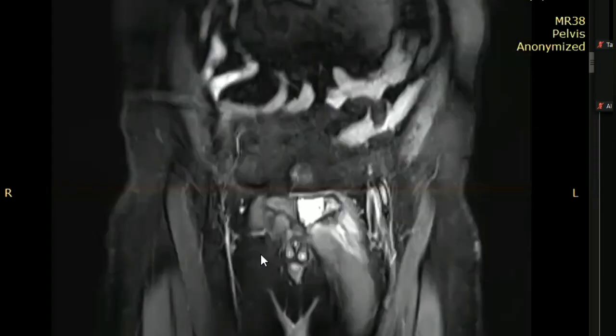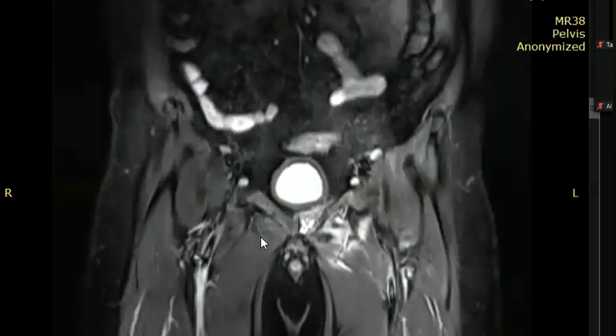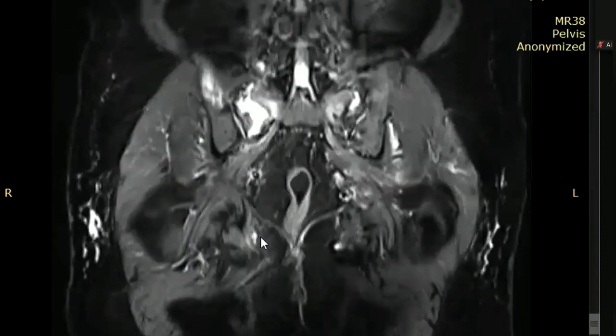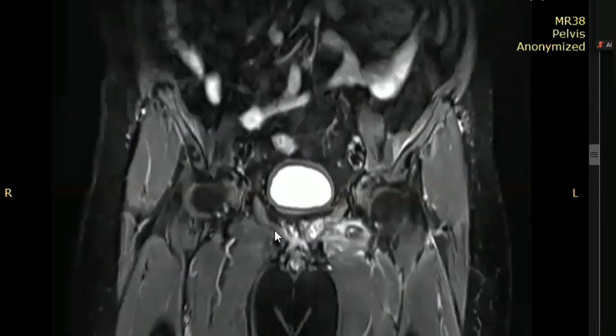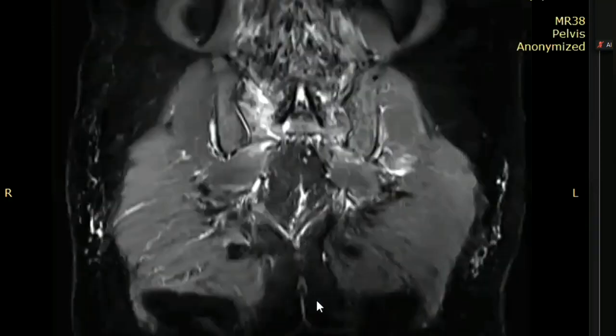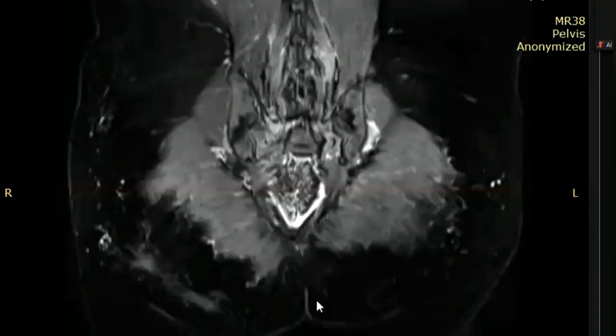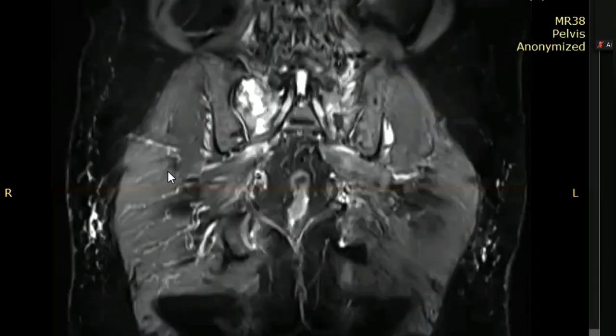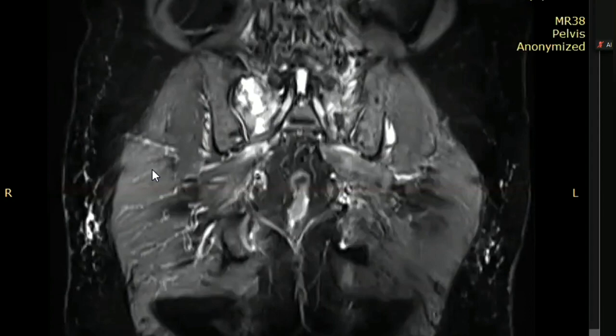So I can see a hyperintense lesion that is involving the pubic bone, the left pubic bone. Can you scroll again, please? Yes, there are some abnormal signal intensity areas in the adjacent muscles as well. Yes, nice pick. Rest of the other side of the pubic bone and symphysis appear unremarkable. So no intra-pelvic pathology.